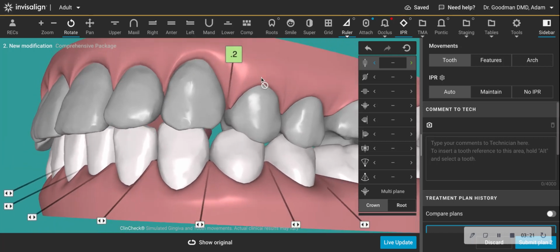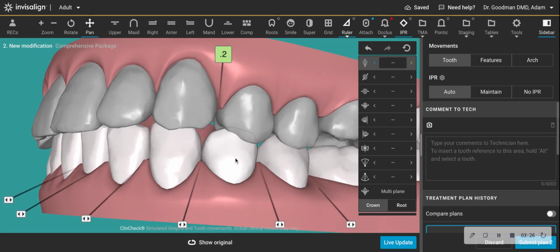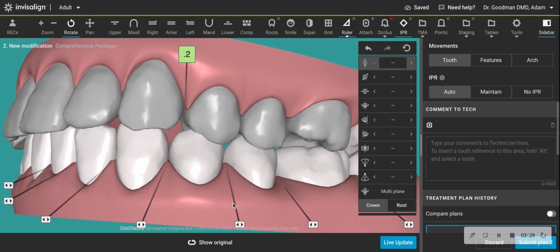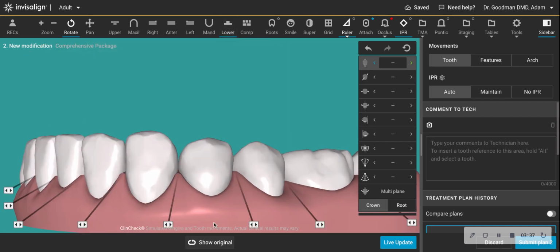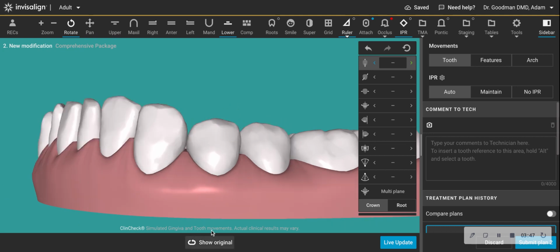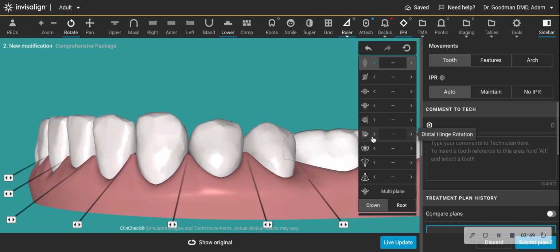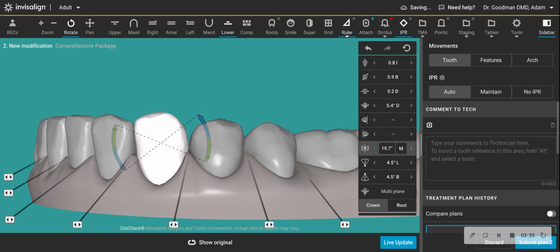So I'm going to show you the modification I make on this treatment for our purposes. This is an adult that we're not going to use any kind of mandibular advancement. We're going to accept this occlusion, this skeletal pattern. But in the lower arch, this is not how teeth move. And I want to set up this plan so I can align those lower teeth, maybe get a little overjet reduction with compensation of the lower incisors. And so what I'm going to do is change the root angulation of that tooth. By the way, look how that brings the lower incisors forward a bit.